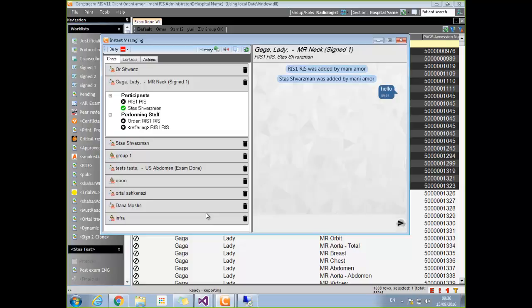Actually, we can add it to the header there, maybe the session number if you like. And maybe even the session number. Yeah. And we don't want to add too many things there. Yeah, we can. It's the good and the bad. Yeah, just something they can use.